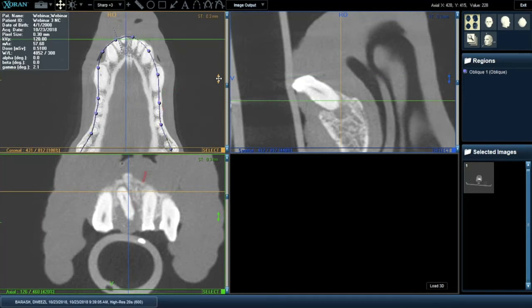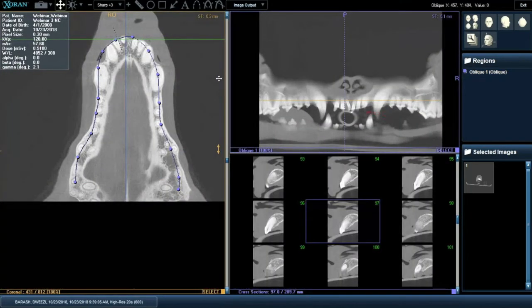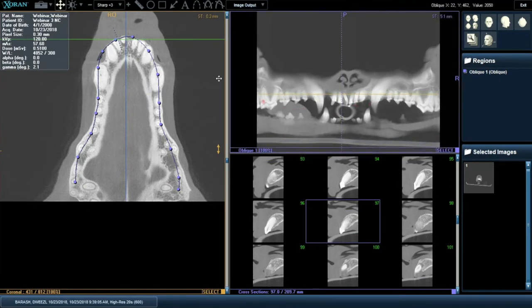If we have a bit of difficulty noticing this, one way to quickly notice and point to bone loss in general is to look at the panoramic view. And how do we do this? We trace the arch. When we trace the arch, we can quickly see bone level all the way across in a rough way. This is not meant to be, again, a very precise diagnosis, but if there was significant bone loss, and in particular periradicular loss, where there would be class 2, class 3 furcations, we would see it very quickly.